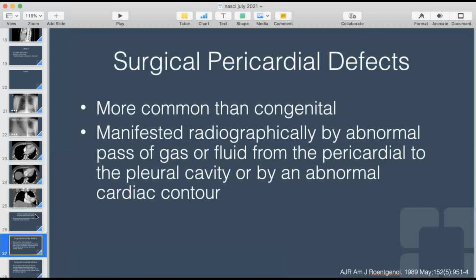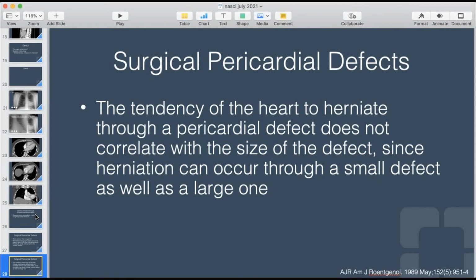This is the patient some months before the one that I showed you earlier, and you can see there that the patient had surgery for pericardial penetration from a knife stab to the chest. I'm going to show you now a CT. Is this a movie? No, okay. And as we move down, any comments, any thoughts about this?